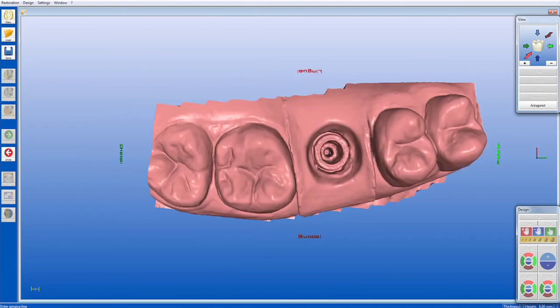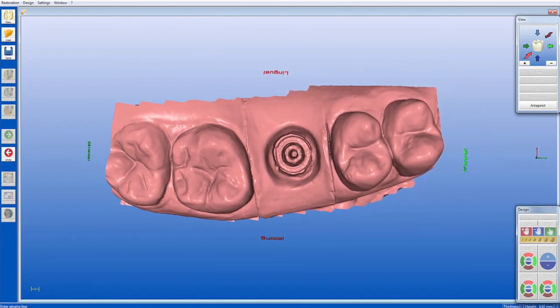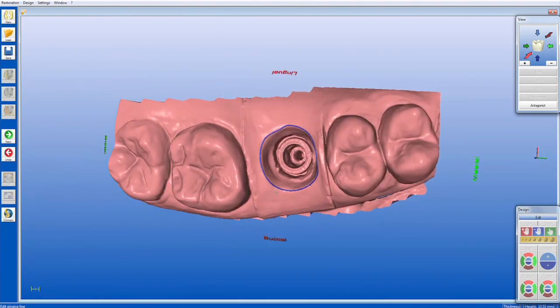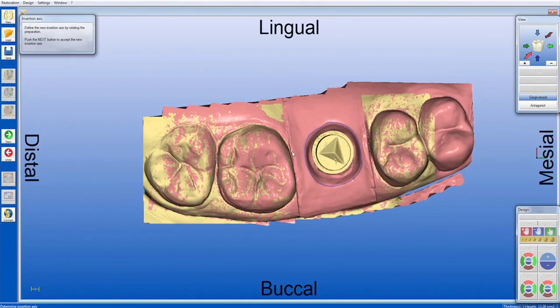We are now able to draw the margin of our gingival mask. This step will always use our manual margin finder tool to trace the line around the uppermost gingival area. Simply double left-click on the beginning of your margin line and proceed around the edge in short segments, saving your progress with single left clicks. Once you have circumnavigated the margin area and returned to your starting position, double left-click to finalize the margin line. Click Next to continue.